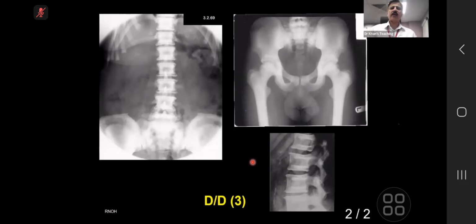osteopetrosis has got a cyclic type of pattern. Cyclic pattern means that there are cycles where normal bone deposition is there, and then there will be more sclerotic bone deposition, and it goes into cycles. People don't know why it happens like this, but this particular sign gives you some leeway to diagnose it. The cyclic pattern will give you normal bone density versus sclerotic bone density at particular parts of anatomy. You will get this bone within bone appearance in the vertebrae like this.